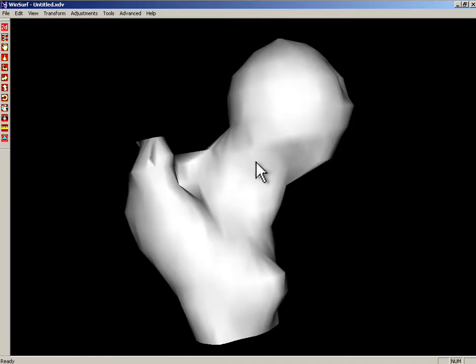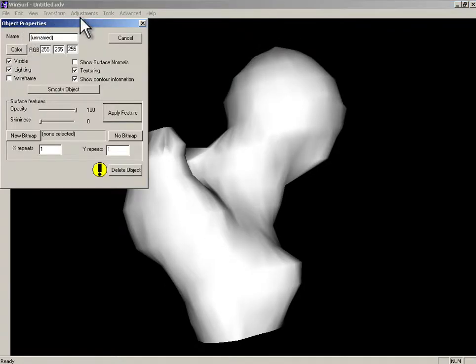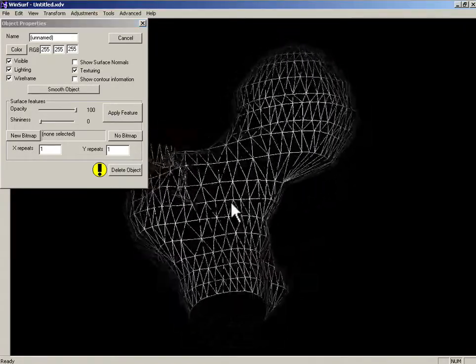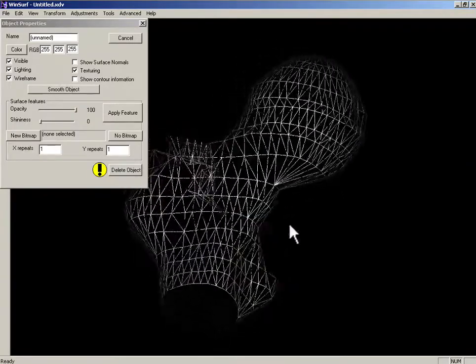And you can double click on the entity to open a window which is controlling the 3D mesh. In the 3D mesh, here you can see a wireframe. That is a wireframe which has been representing the outlining you did.